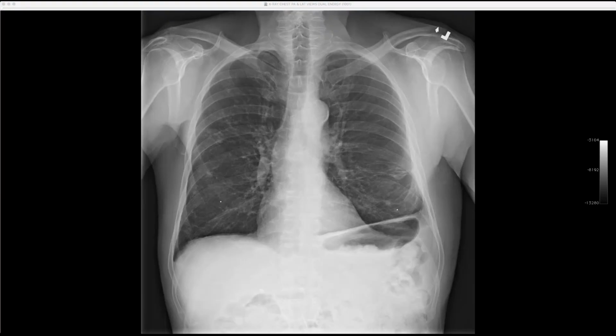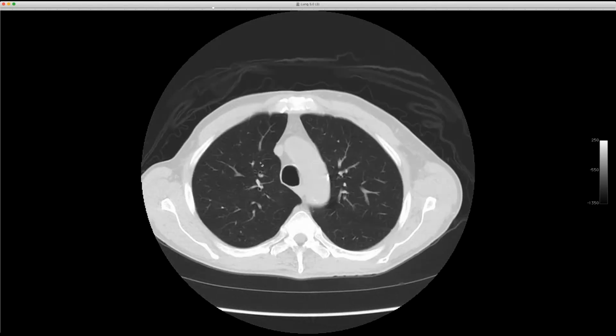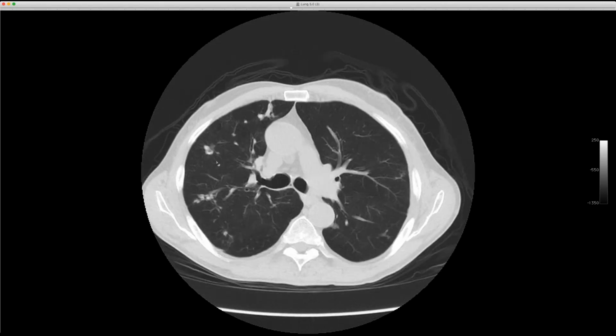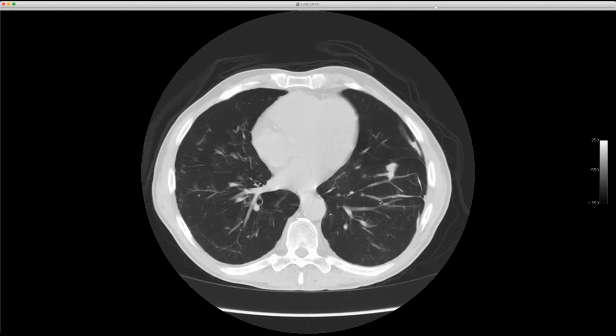And then, because we like to see more blasto, this was a follow-up. This one's a little more interesting, so I'll show the radiograph, in that this guy, I've never seen this happen with blasto before. So this is a radiograph from this week. And you can see he's got some scarring, volume loss on the left, and a bunch of nodules that are fairly conspicuous. There are probably some calcium in it. And I found a CT from 2015 where he was acutely ill and had these large nodules. And throughout, kind of looks like our last patient. There's some scar down there.